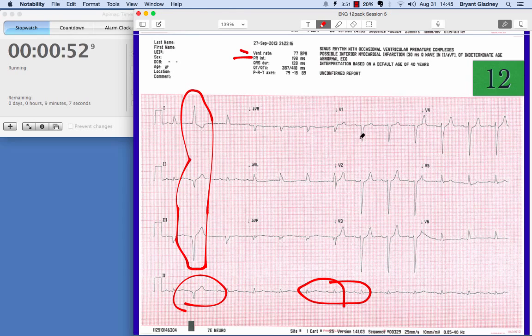And so we do have some bundle branchy stuff to look at here. The QTC is not an issue. So what we've got is a left bundle branch pattern. If you've done the turn signal thing, you color in the last part, see which way it's pointing. It's pointing down. If I were going to be making a left turn with my car, I would be pushing the turn signal down. So I have a left bundle branch block.